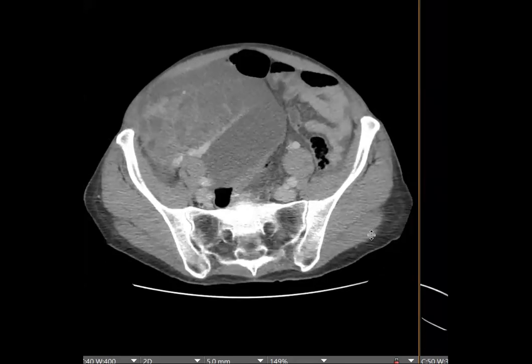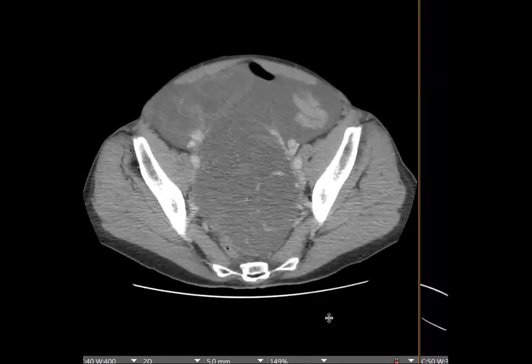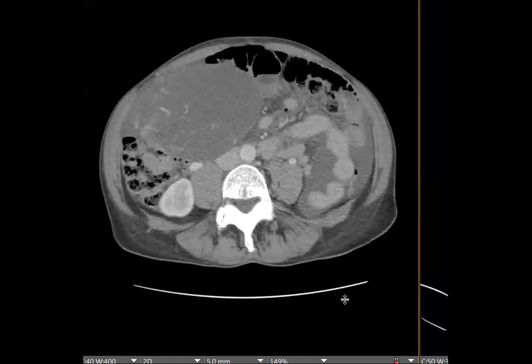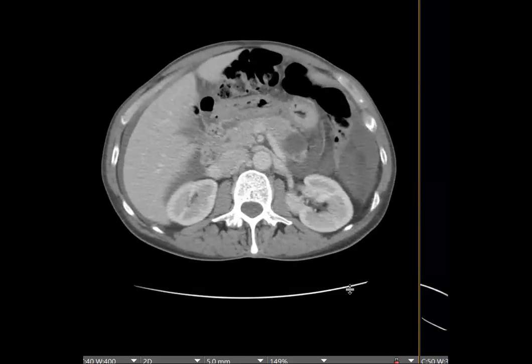And Aarti, feel free to add any additional points. Yeah, this is a great example of how ovarian Krukenberg tumors can be massive compared to the primary. I do have some questions. Whenever I see possible Krukenberg or bilateral ovarian masses, I always look at the stomach and the pancreas first. Sometimes also the appendix, colon, especially if you're looking for a mucinous primary. Appendix loves that. But with this pancreas one, when you said pancreatic adeno with mucinous subtype, I'm curious, were they able to distinguish if this was an adeno with mucinous features or an MCN that went really bad, like an MCN with adenocarcinoma developing in it?